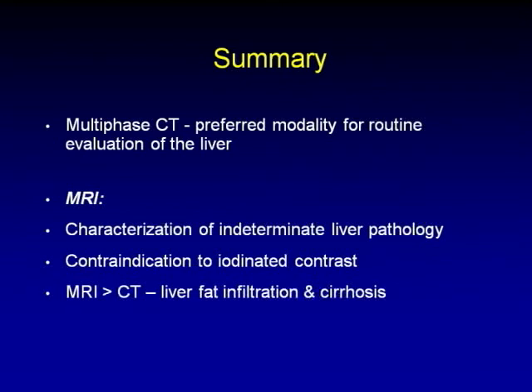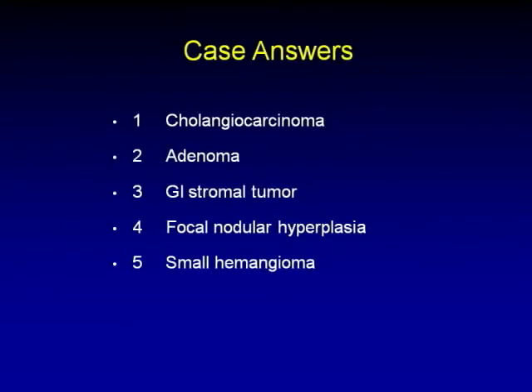So just to summarize, multi-phase CT is the preferred modality for evaluating the liver, and MRI really is your backup modality for evaluating indeterminate liver lesions, and it is more sensitive for detection of fat and cirrhosis. Thank you, and here are your case answers.